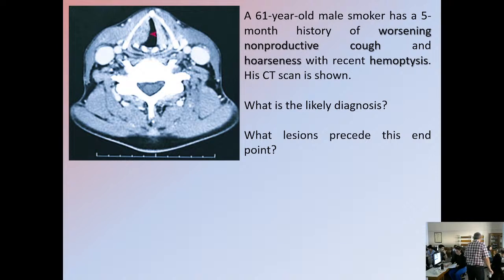So you'll take that into account. This is not always the case. Remember that we saw a squamous cell carcinoma in the tongue when the lining epithelium was normal. However, that was an exception. The rule is that if a malignant tumor arises from the covering epithelium and you see the neighboring covering epithelium, it probably is dysplastic. It shows some degree of dysplasia, most commonly high-grade dysplasia.